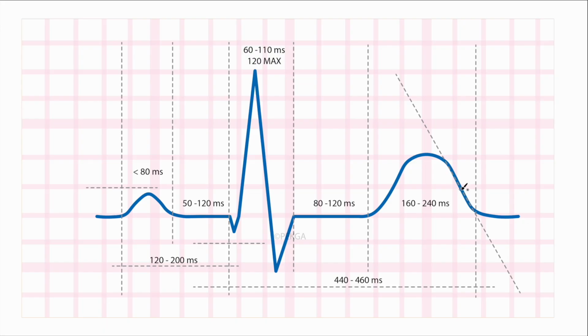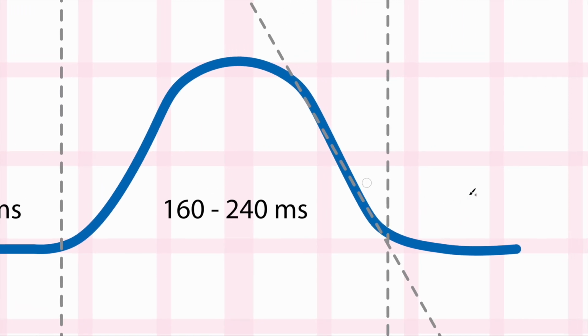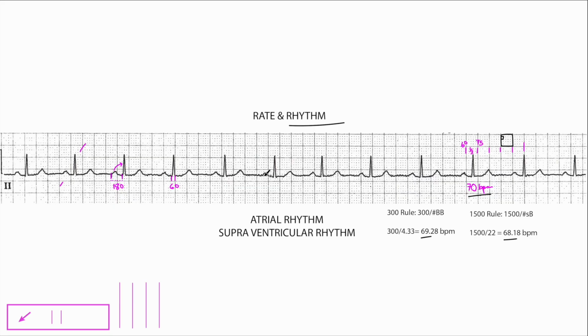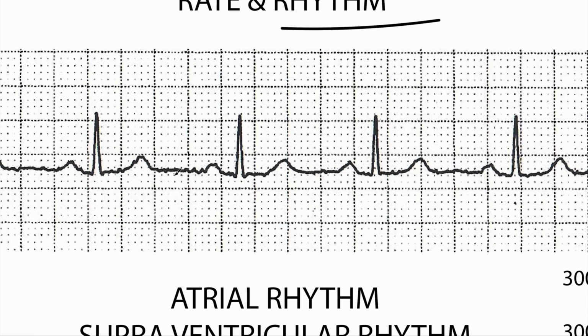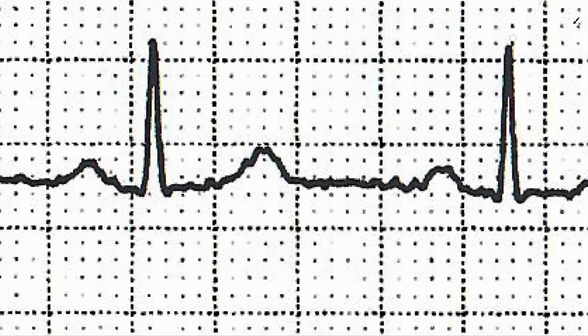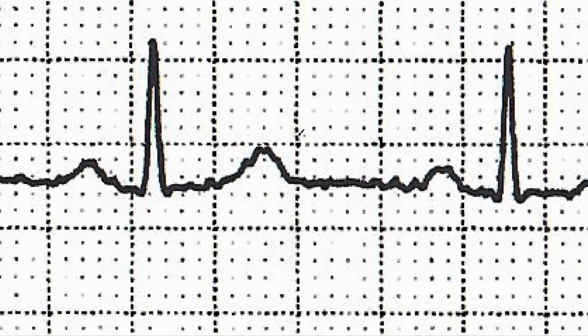But as far as your QT, the reason I'm going to this window is when it comes to your T wave, this is not a great example to do it on. Let's use a different one, but we're going to be talking about slopes. Let's use this right here. This is good. Okay, let me make my pen into a finer point. Oh no, let's use a line.